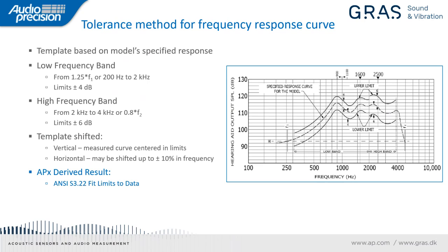Of course, these days, these standards were written many years ago when people used transparencies. No one uses transparencies today, and this is all done via software. And I wanted to point out that we've added a new derived result to the APX software called the ANSI S3.22 Fit Limits to Data. And I'll be showing that later in the demonstration.